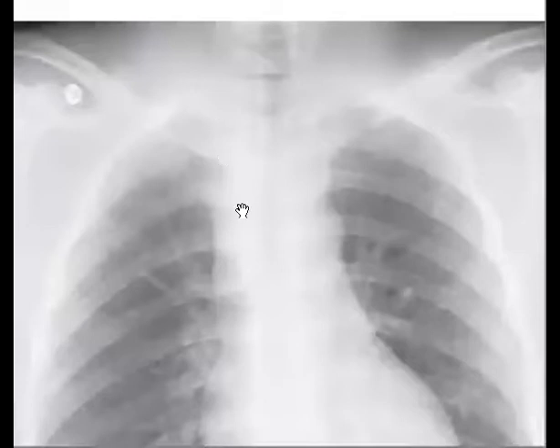You can see here in the X-ray again that the right sternoclavicular joint and clavicular head are directed down, right? It is a bit directed down relative to the sternum.